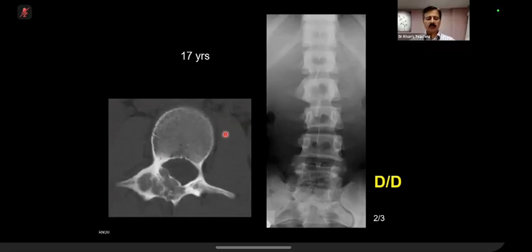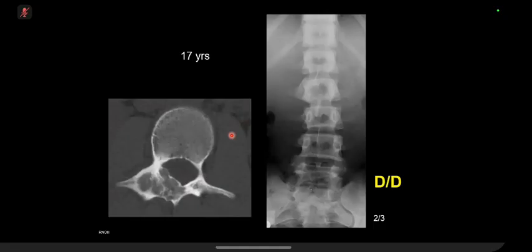What do you think now on the CT scan? What is your conclusion? So it's an expansile lucent lesion with quite dense sclerosis around it. I still think that an osteoblastoma would be a differential diagnosis to consider, but it could also be an ABC. Right. What will help you to discriminate between the two, osteoblastoma versus an ABC, an aneurysmal bone cyst? I think an MRI. Okay, we'll come back to that.